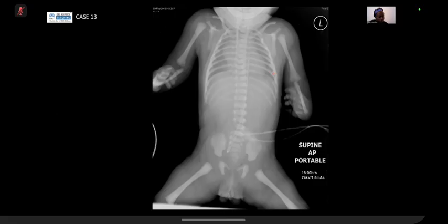For the umbilical venous catheter, I see it should be adjusted to go to the junction of the inferior vena cava and the right atrium. I see it directed to the right hepatic vein, or could be in the right portal vein branch. Okay, that's correct. Okay, sorry, carry on assessing the radiograph.